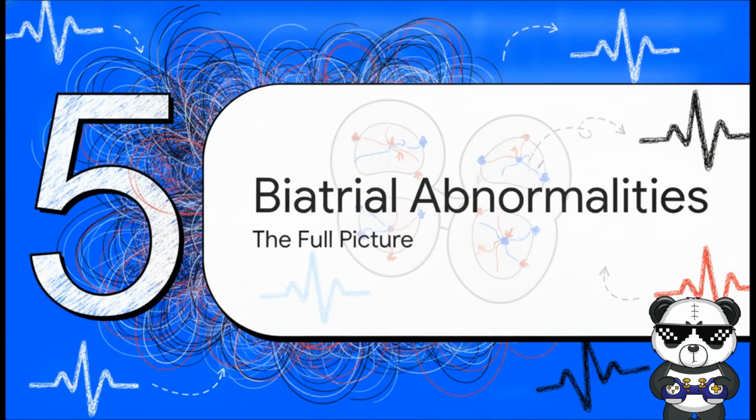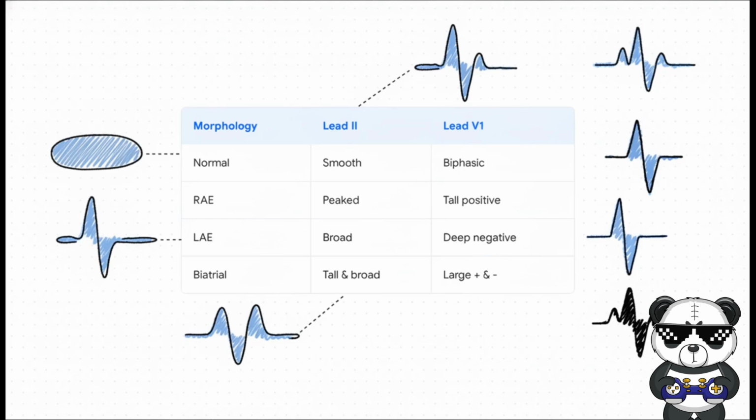Finally, Section 5, Biatrial and Other Abnormalities, the full picture. Let's bring these combined pathologies into focus. Bringing it all together like this in a single summary matrix just makes the pattern recognition so much simpler. Biatrial enlargement happens exactly when the criteria for both individual enlargements show up together. So in lead 2, the wave is both tall and broad, and in V1 you get this massive positive initial bump immediately followed by a massive negative drop. Honestly, if you can memorize this matrix, categorizing these structural changes becomes almost second nature.